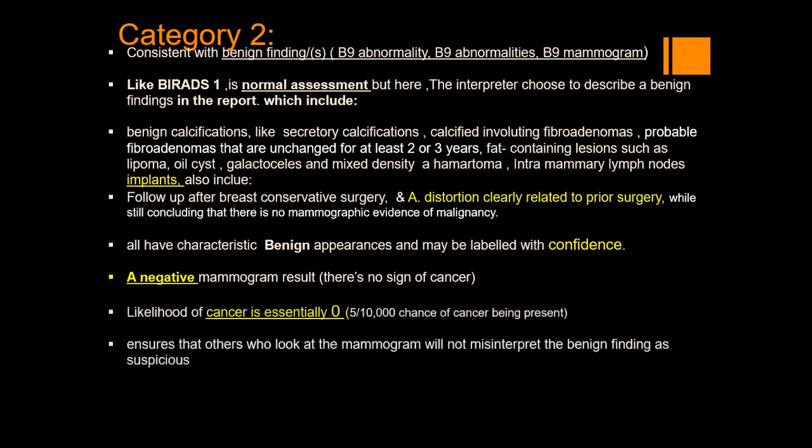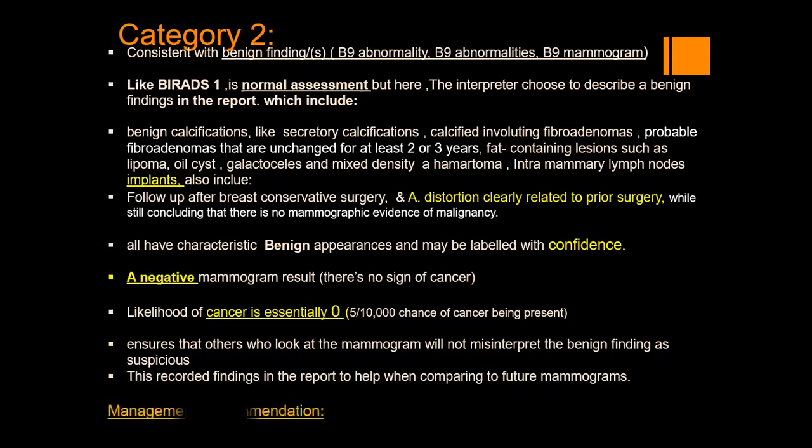And we said the likelihood for malignancy is essentially 0, and the changes mentioned in the report ensure that others who look at the mammogram will not interpret the benign finding as suspicious, and these recorded findings in the report will help when comparing to future mammograms. So the management will be like BI-RADS 1, just routine screening mammography.